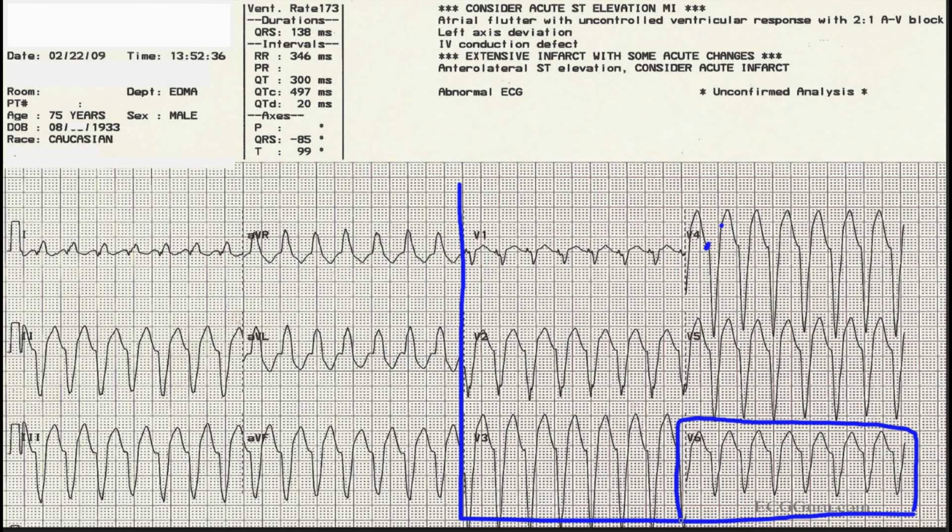The normal ECG has a positive or upright V6. There are very few conditions that cause a negative V6 other than VTach. So that's a real quick and easy one that you can remember for the field. In a wide complex tachycardia, a negative V6 strongly suggests VTach.